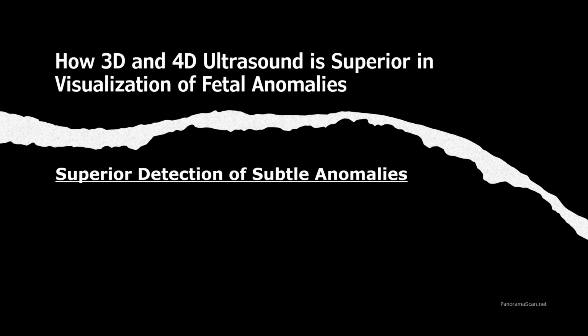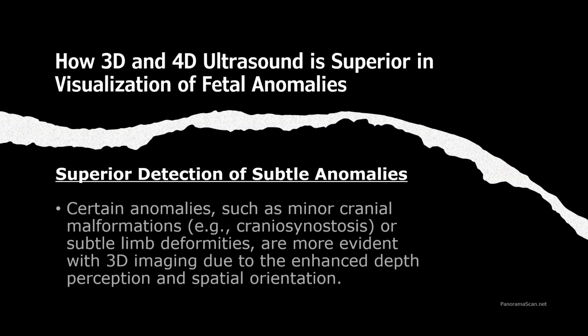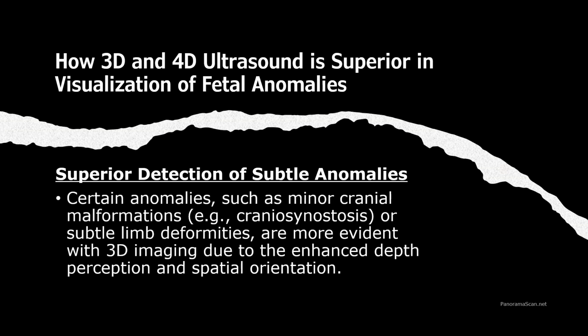Superior detection of subtle anomalies is a significant advantage of 3D and 4D ultrasound in fetal imaging. Enhanced depth perception. 3D imaging provides superior depth perception and spatial orientation, which makes it easier to detect subtle cranial malformations such as craniosynostosis or minor limb deformities.